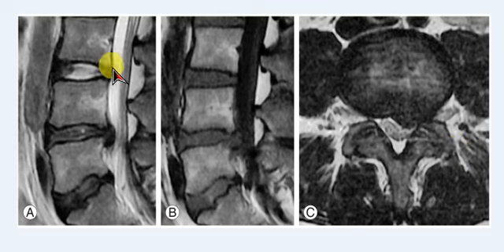This is called the mid-sagittal image. Why am I saying this is mid-sagittal? Because I can see the vertebral bodies as well as the spinous process in this view. If we are unable to see the spinous processes, then it will be a para-sagittal image. Similarly, this is also a mid-sagittal image, and this is basically the horizontal or cross section.